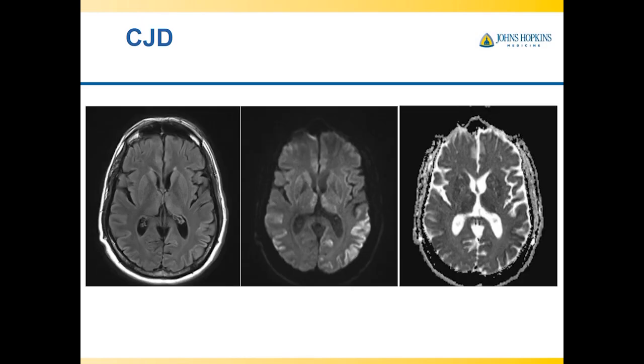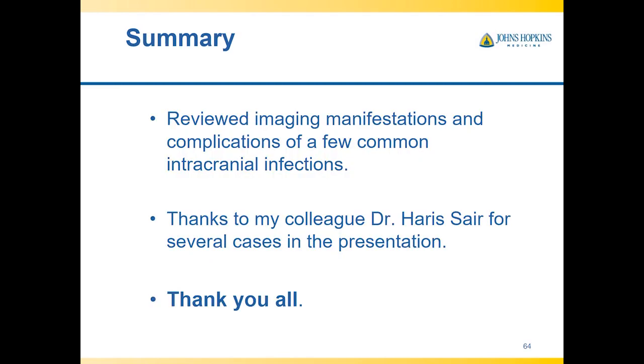On the other hand, in this patient, we see cortical involvement with diffusion restriction more on the left as compared to the right, but there is also evidence of involvement of the medial and posterior thalami with a classic appearance that has been described as a hockey stick appearance due to its shape and involvement of the thalami. This has been a finding described with variant CJD.